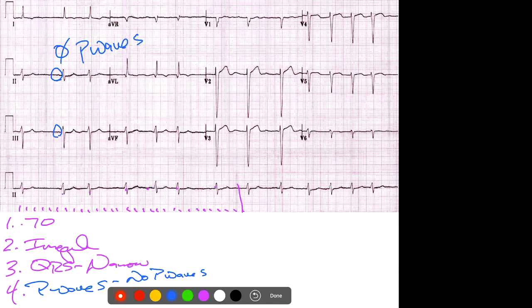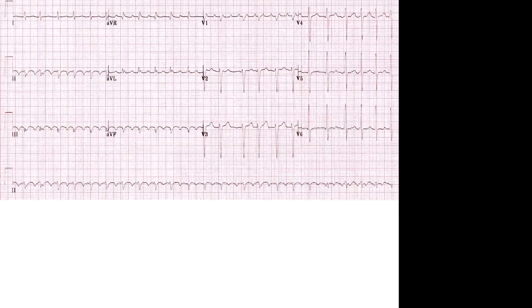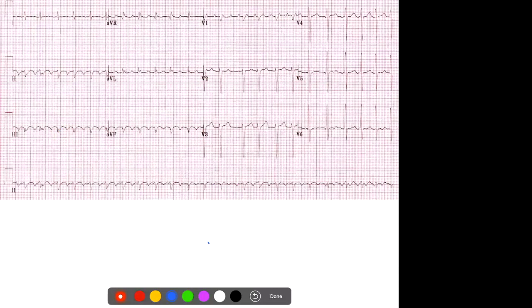All right. The next one. Oh, this app. Okay. That last one, I'm calling that AFib. Sorry, I didn't mean to move on. My finger is hitting the buttons instead of my pen on the iPad. I'm calling it as AFib. Yeah, you're right.